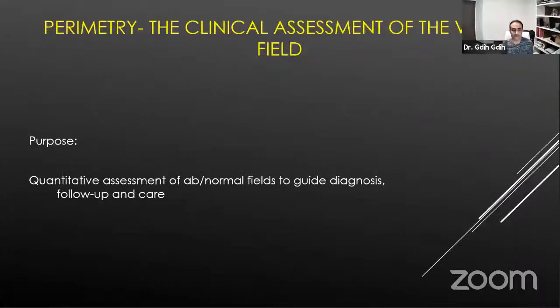Minutes and then get that information. It is the only way to have a quantitative assessment of a normal or abnormal visual field. It guides us for the diagnosis and also for the follow-up and care of that patient.